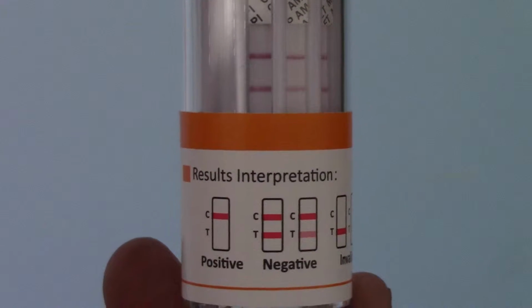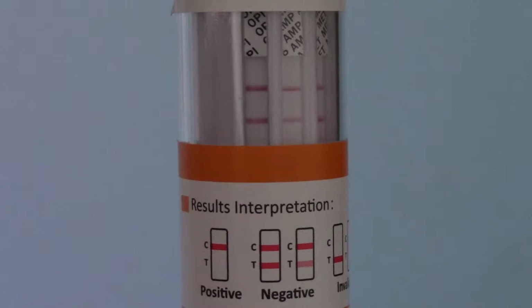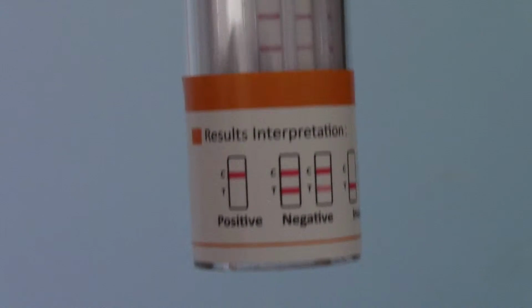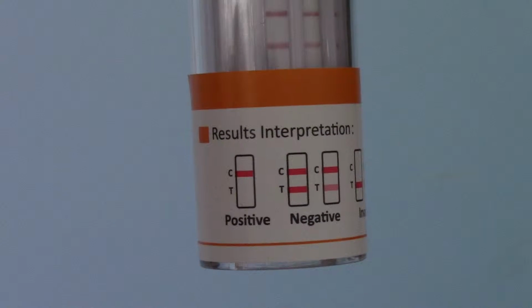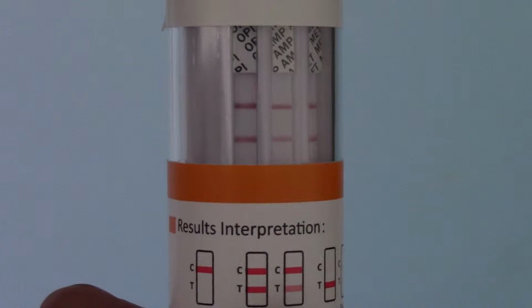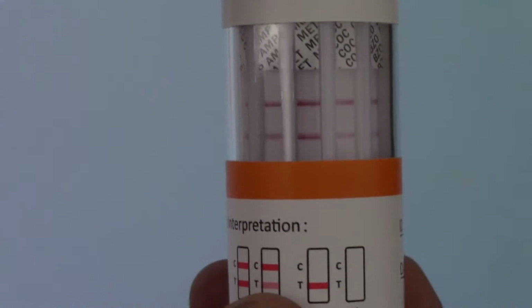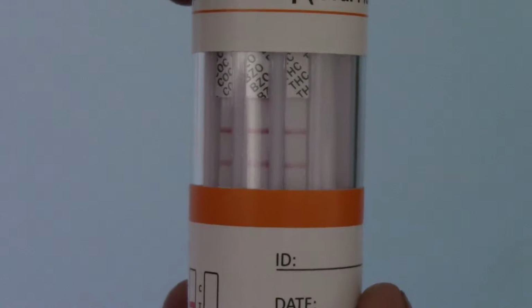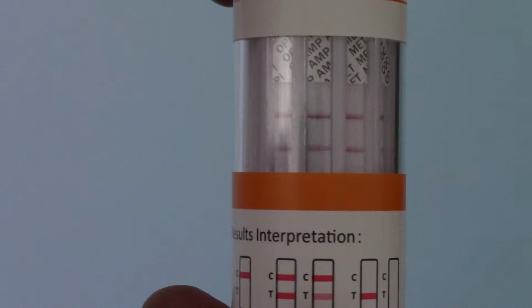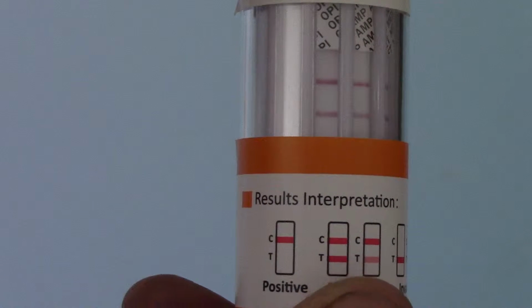And then for the interpretation of the results, you're looking at the control line, which is the top line nearest to the coding on the strip, and the presence or absence of a test line showing at 5 minutes, which is, as indicated on these results interpretation guides, the lower line that forms the test line. So we've got 2 lines on 1, 2, 3, 4, 5 and the 6, indicating that this test was all negative. So no drugs were detected. You've got 2 lines showing.